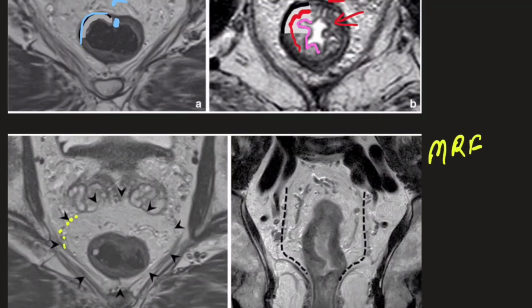See this thin fibrous structure which is surrounding the rectum, the adjoining mesorectal fat, and few lymph nodes and vessels in this mesorectal fat. It's actually the visceral layer of endopelvic fascia, and MRF is actually the anticipated resection plane while performing a total mesorectal excision.